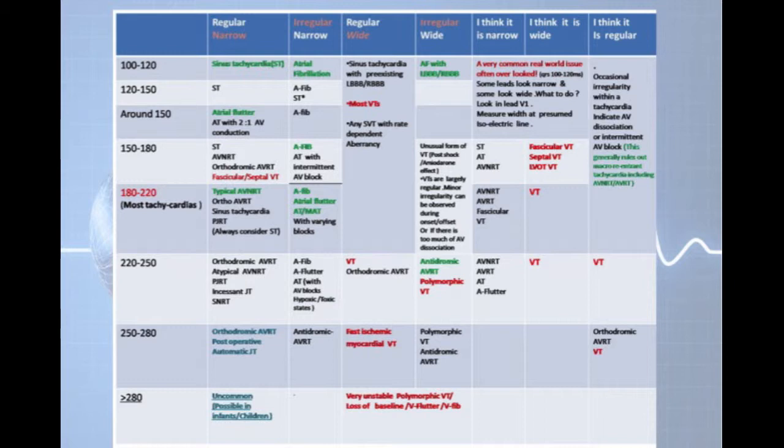Venkatesan from the Madras Medical College. This is included in your student packet. This shows the representation of tachyarrhythmias and where the electrical rate probably originates from. I'm a visual person, and this shows me a few things. One, that most rates around 190 and below originate above the AV node.